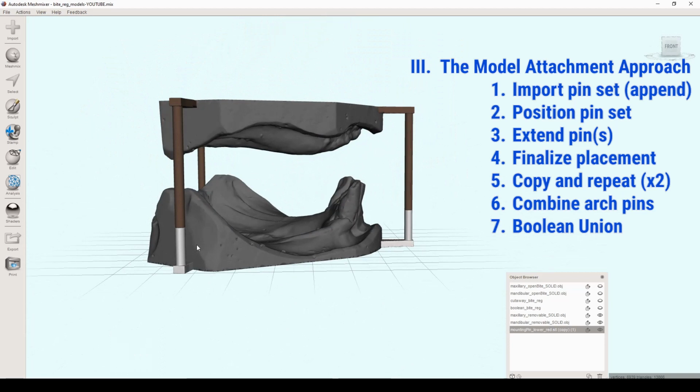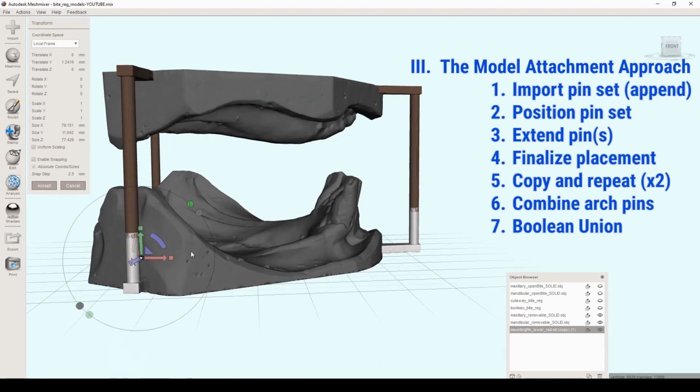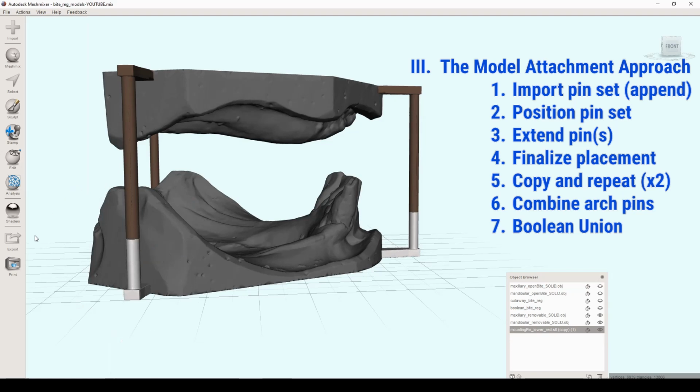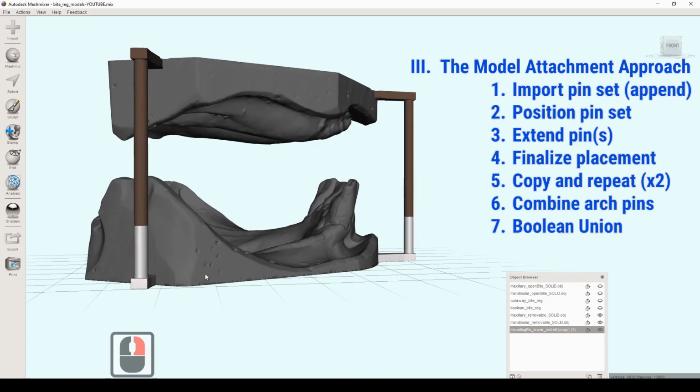So the first thing I did was I go, okay, great. Let me just try selecting just the pegs, and I'm going to hit T, transform. I'm going to bring this up a little bit. Oh, shoot. If I do that, now I've ruined this interface like I was talking about. So I'm going to hit cancel. I could try to select the bottom, then I have to do that for each one of these and try to bring it up, but there's an easier way.